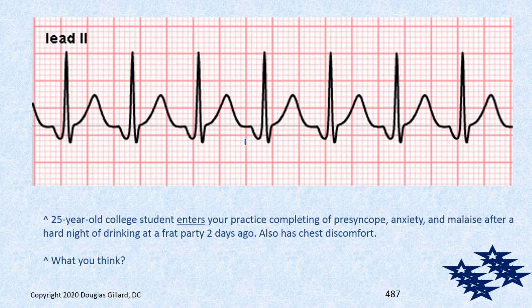Now let's analyze it a little more. Is there a P wave? Well, we find the T wave, and yeah, that's a pretty big T wave. But again, if you're thinking about heart, you're not going to think of a heart attack in a 25-year-old, and it's got to be more than half the height of the QRS complex. So I'm not really worried. It's not sharply peaked either. But it's possible. I mean, it's a little peakish looking. So you think maybe hyperkalemia, but probably not.